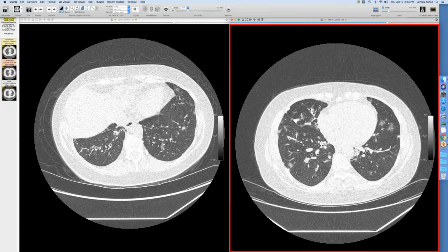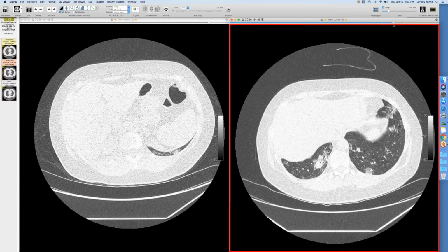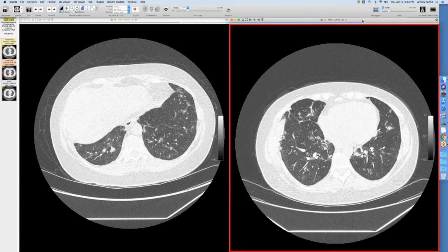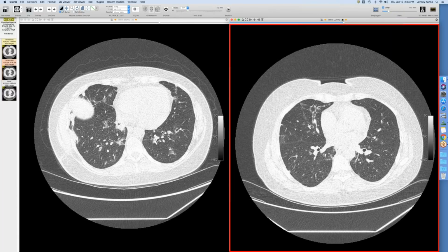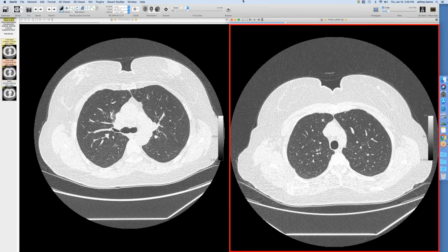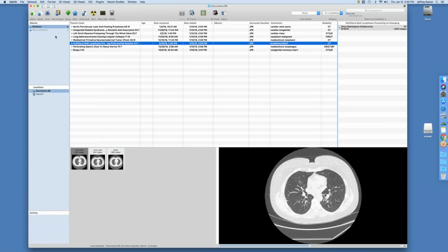And then there was just another CT done a few months later, and you can see this is just kind of continuing to slowly get worse. And these can be hard to treat because they're often very indolent, but if they start acting up, they will consider using some chemotherapy. But they're generally indolent or at least low-grade lymphoma, so a MALT lymphoma.